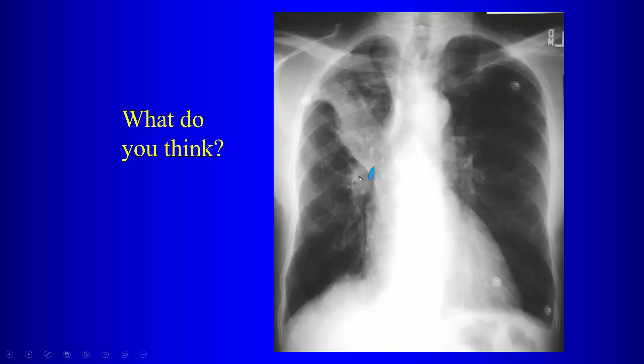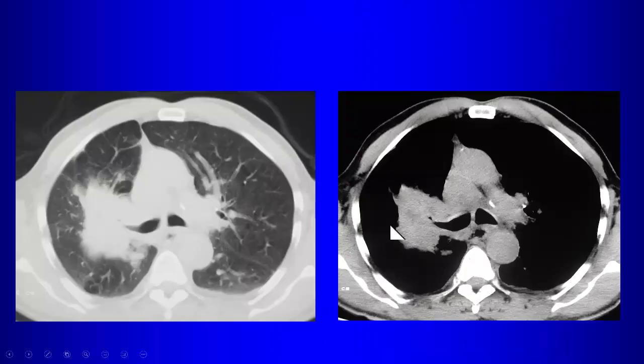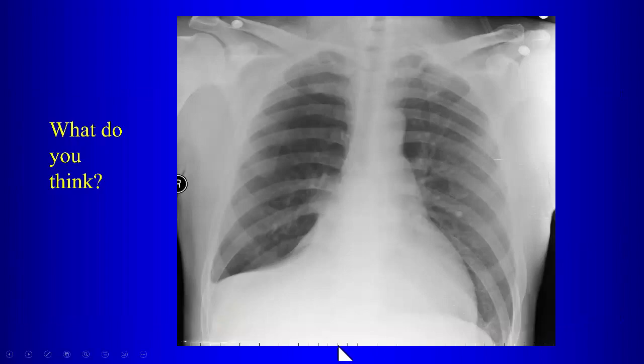Mass, central obstructing mass. So this is obstructive atelectasis then from a central obstructing tumor if we have the S sign or the reverse S sign of Golden. So we have right upper lobe collapse, but there's a bulging in the fissure. So usually that means that there's a central obstructing tumor, there's atelectasis, but this portion of the fissure is not able to collapse against the mediastinum because of the presence of the central tumor. So that is the S sign of Golden or reverse S sign of Golden, and it's associated with central obstructing tumor. The cell type of this tumor you might suspect is what? Squamous cell, yeah, there's obstruction of the right upper lobe bronchus, a large central tumor. This was squamous cell cancer, okay?